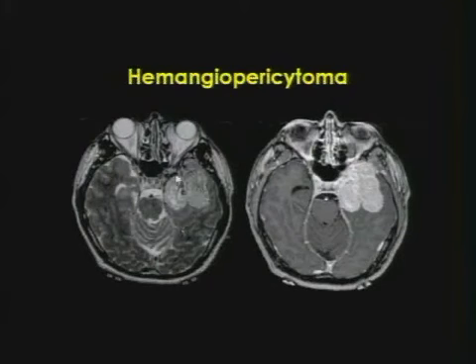When you're looking at an extraaxial tumor, all in the world looks like meningioma, but you don't really get the sense that this has a thick dural attachment as normally a meningioma would. And also you see these very obvious vessels inside the tumor. Think about hemangiopericytoma. These are very vascular tumors. It used to be called angioblastic meningioma, but now they have their separate name.